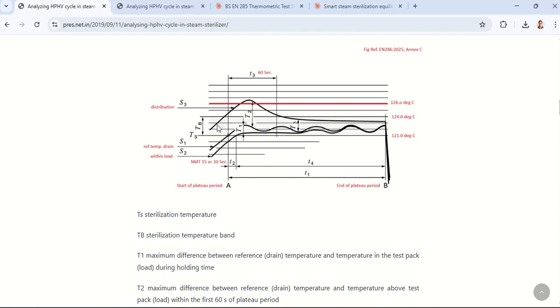And you see how these three lines are moving within the window of the plateau. What is the plateau? You could see it here, starting and ending where you see the hump in your cycles. Normally the equilibration plus the holding time is your complete plateau in your cycle. The plateau ends where your cycle drops after your exposure, and the plateau begins where you start your equilibration time.